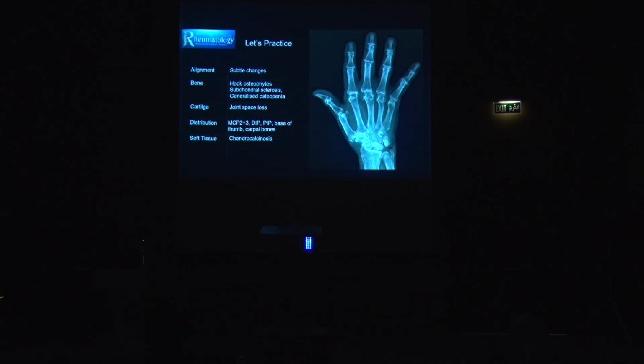Again, this is... Okay. This is a secondary osteoarthritis. Why? Because you see the joint space narrowing is uniform. When the joint space narrowing is uniform, it's usually secondary to another disease. So the cartilage is damaged because of something else, not primary osteoarthritis. And do we have a clue to what this something else could be? So you can see here, although it's faint, there is chondrocalcinosis.